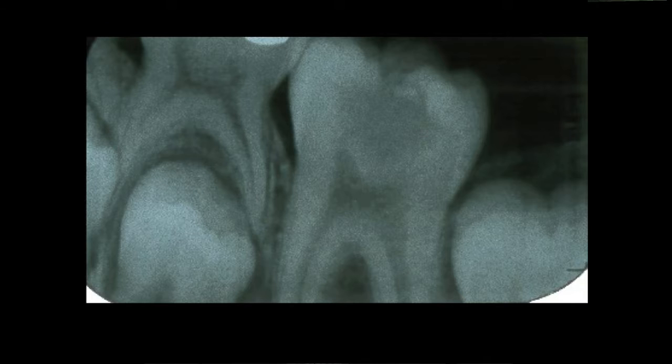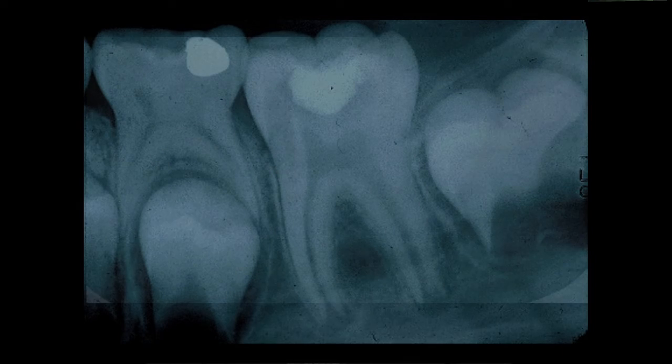Here is a bite wing x-ray which shows clearly the cavity in this lower molar, which is going to expose the pulp. However, this is not adequate to do endodontic treatment to go in and expose the pulp on this tooth. You must have a clear image of the roots to see the root development and what's around the end. So here is another film of that same tooth, and you see that the apices of this tooth are wide open and not formed. Therefore, conventional endodontics on this tooth would be impossible to obtain.